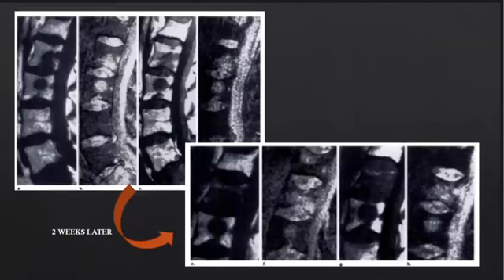This case shows a patient with metastatic disease. On the initial MRI, multifocal signal intensity abnormalities were distributed throughout the vertebral column. Metastatic foci are seen at L2, L3, and sacrum, with low signal intensity on T1, absence on fat, high on water, which is accentuated on STIR image.